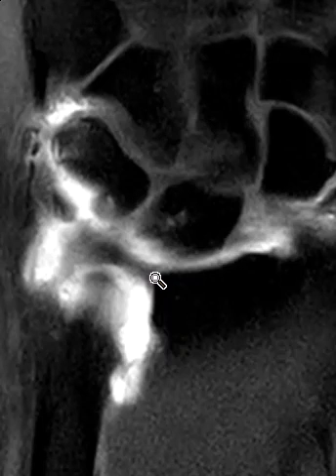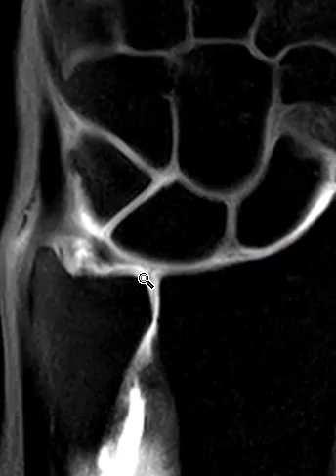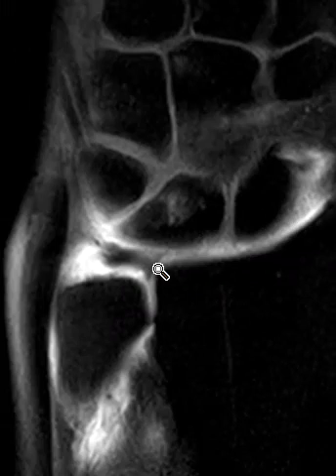Here's that palmar band, central disc. It's super, super thin. It could be a little full thickness perforation there. Just can't quite see it. Maybe related to slice selection, but this should be really thick right here, almost as thick as this, but it's very thin. And we go to the dorsal band coming across here.